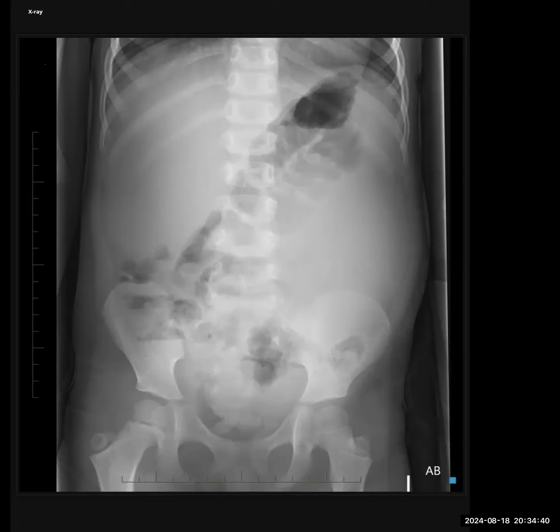So in this patient who had a palpable left-sided mass, in this abdomen X-ray also, I can see a soft tissue density lesion occupying the left side of the abdomen, extending from the lumbar region all the way up to the iliac levels, displacing the bowel loops towards the center. I would convey these findings to the referring clinician in order for a CT scan of the abdomen with contrast for further evaluation of this patient.